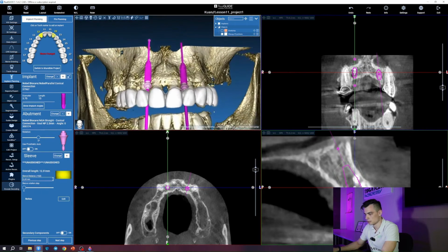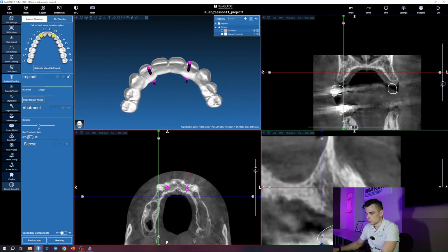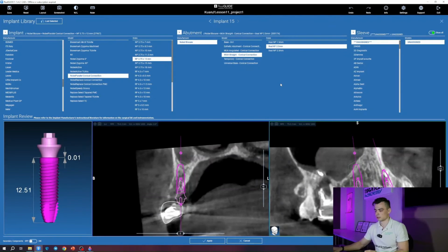All right, now it's starting to come together. Excellent. Now let's move on to the distal sections. And let me remind you that in the distal areas, we place the implants at an angle tangential to the sinus. So here is where the sinus will be. And this is roughly how we position the distal implants.